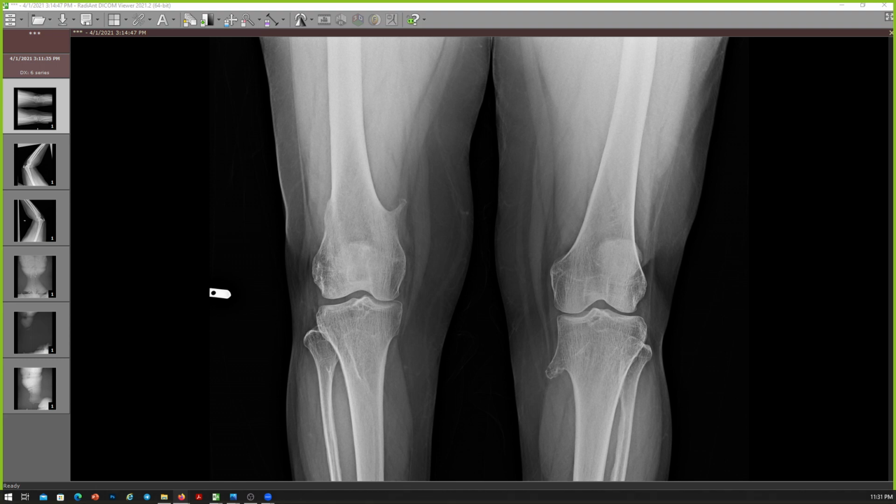I would like to correlate with previous images to check if the patient is a known case, and if so, I would like to check for any change concerning for malignancy. I would like to know the clinical history of the patient, if he has pain or any symptoms that are concerning for malignancy. And if this is a new case, or if there's any change from previous, I would like to go for MRI to check for the chondroid cap. If it's more than 1.5, then I will be concerned for malignant transformation.